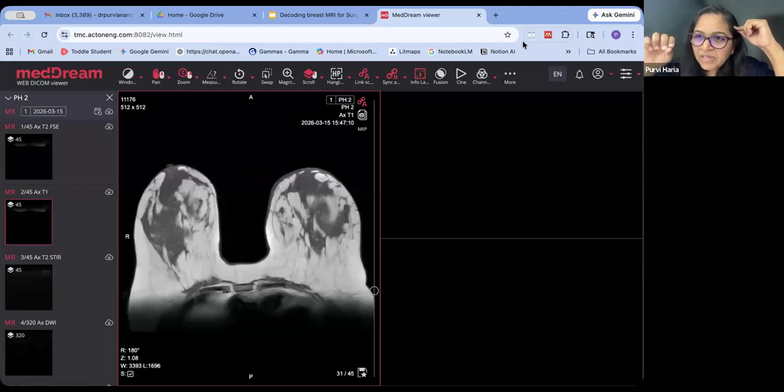The confidence is more when there is nothing else in the breast parenchyma. If the entire rest of the breast on ultrasound is very homogeneous, either very homogeneous fatty or very homogeneous fibroglandular parenchyma, then I'm able to identify those subtle non-mass areas, and probably I can mark that for you.